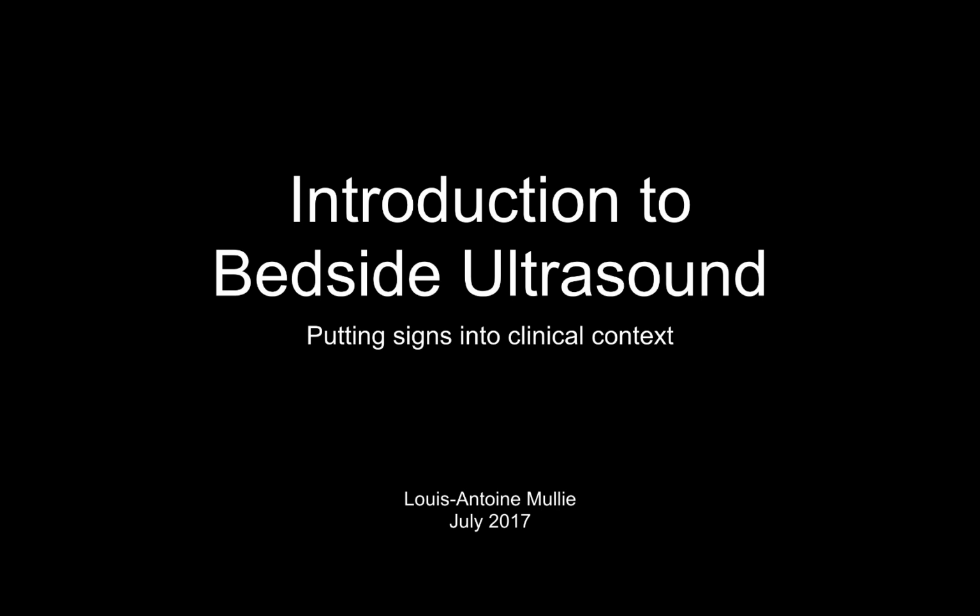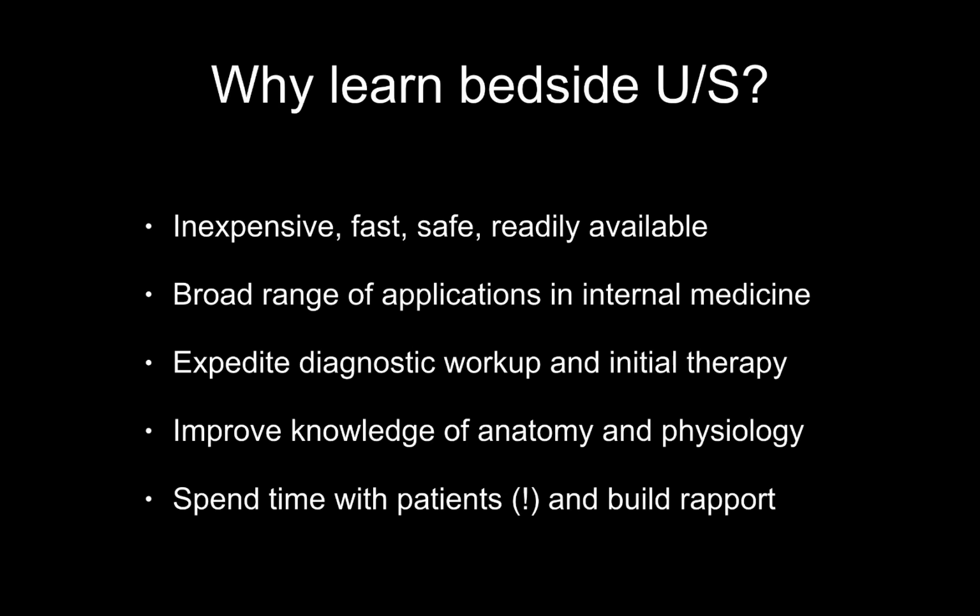The purpose of this capsule won't be to go over the scanning technique, but rather we'll focus on reviewing the anatomy and we'll go over some of the key abnormal findings that you may encounter when practicing bedside ultrasound.